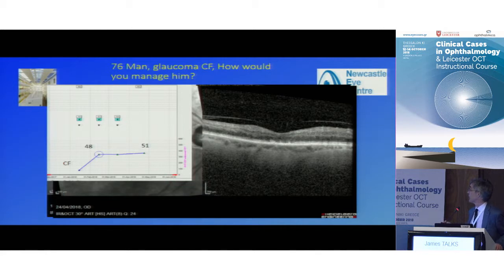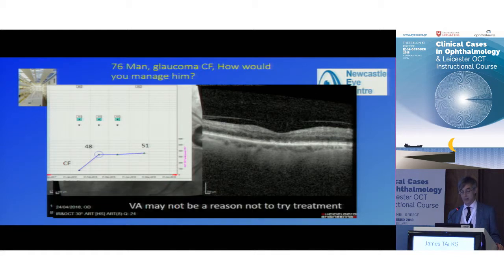There is some disturbance here, so the RPE is not healthy, and you will see that in central retinal vein and in branch occlusions where the RPE gets a bit damaged. The photoreceptors, the external limiting membrane where the photoreceptors are meant to be, are damaged. This is an ischemic eye. But from count fingers to 6/24 or something, it's not too bad. So that gets difficult. Does that mean any CRVO, however bad, we should just treat them?